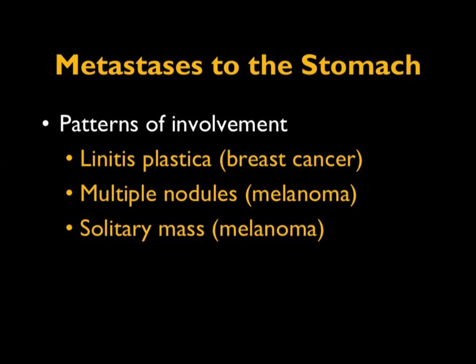Now, it's also important when we talk about gastric tumors to mention metastases. Metastases to the stomach are not uncommon. There are different patterns of involvement. Classic linitis plastica, we talk about breast cancer. We talk about multiple nodules like with melanoma, and solitary masses, also melanoma. We talk about this infiltrating process, linitis plastica, and that's so classic for breast cancer.